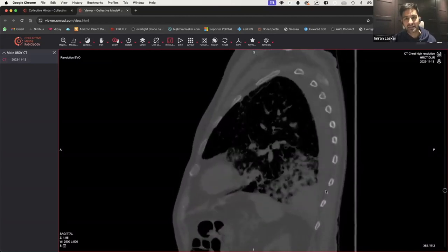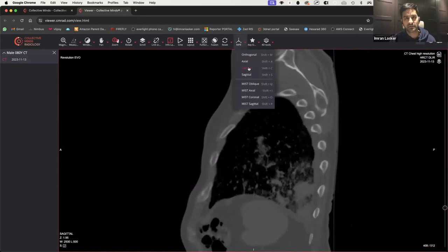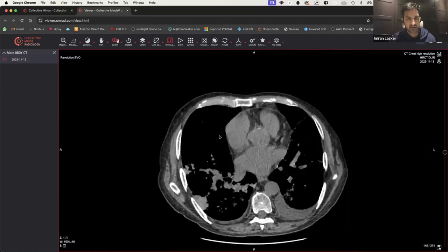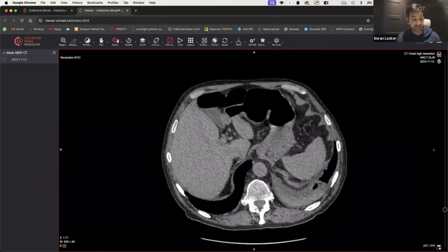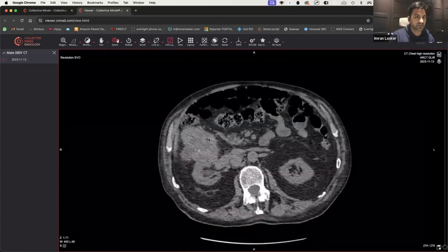And I haven't seen any sort of abnormalities with regards to the rest of the bones. So someone said that, which is actually a very good point. I have to say though, this is a non-contrast study. So unless it's blindingly obvious, I wouldn't really go with it.